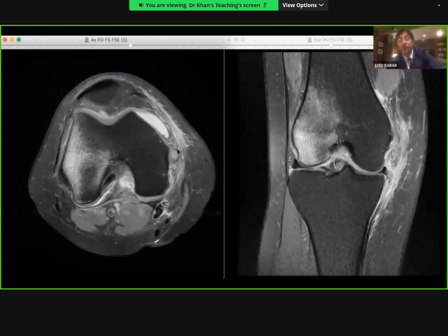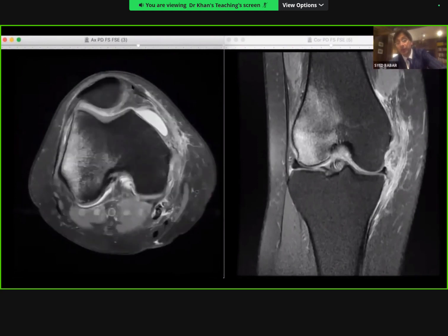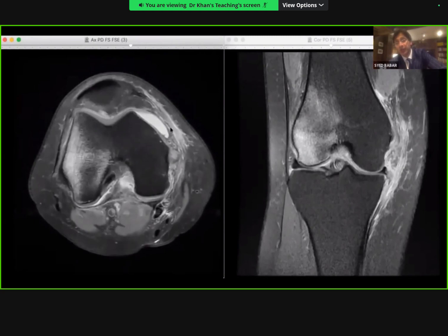So you've damaged the entire medial support of the knee now. So this knee is unstable, because there's nothing on the medial side protecting it. All of it is disrupted. And of course, the patient is lucky because the patella has not gone all the way to the other side, because there are probably still medial patellar retinacular fibers holding it, because the MPFL is not completely torn, it's partially torn. So immediately you can see, just bringing up the 3 sequences, you've pretty much managed the whole case.